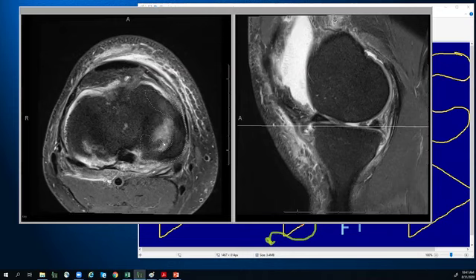The more appropriate name, I do agree with flap tear, and I think that's perfect. But the name that comes up sometimes when you're looking at the literature would be the parrot beak tear, because of kind of this shape of the tear pattern. And this is what happens when the radial tear is combining with a longitudinal tear. It kind of creates this shark fin or parrot beak-like appearance. So this is what a parrot beak tear looks like. I will show another case.